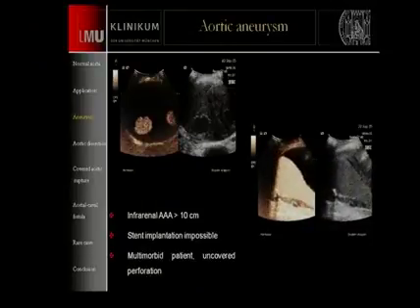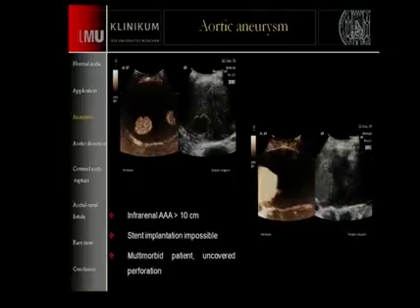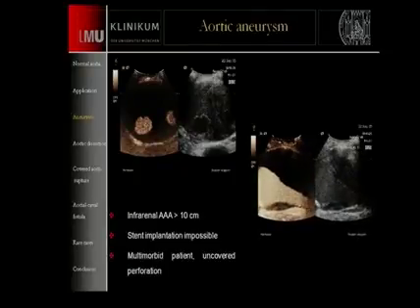This patient will, most of the time, be treated by aortic stent grafts. Unfortunately, a stent graft implantation was not possible. A couple of days later, this patient died.